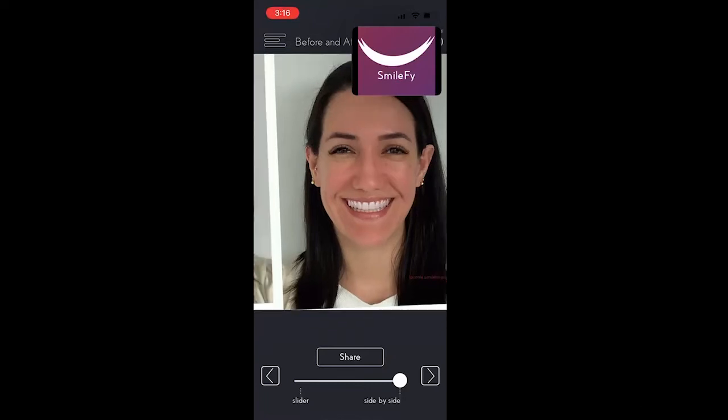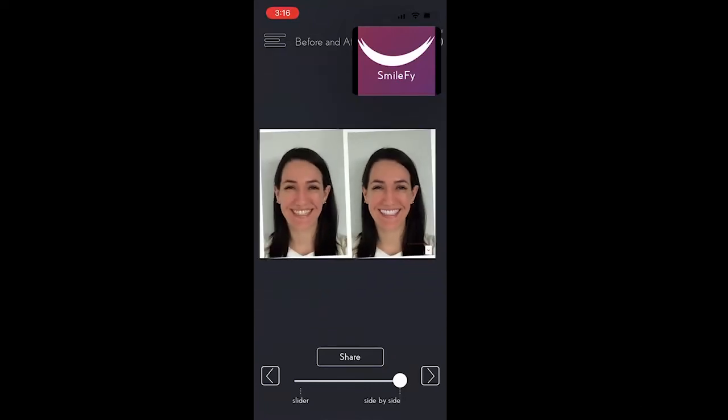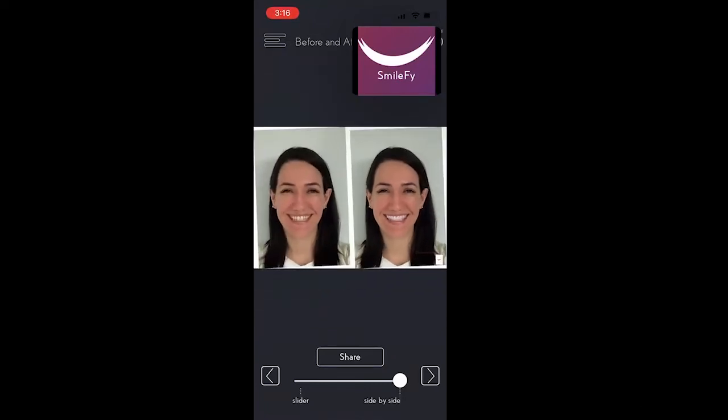With the simulation in mind, the patient agreed to take the intraoral scan and agreed to come back on a second visit to perform a SMILE trial, now with the option that I proposed to her. So now let me go back here.